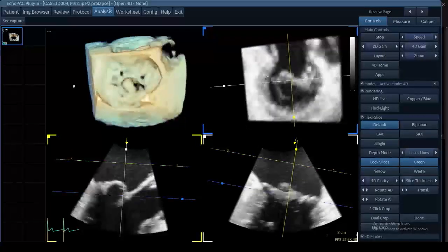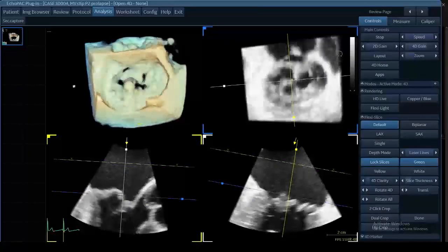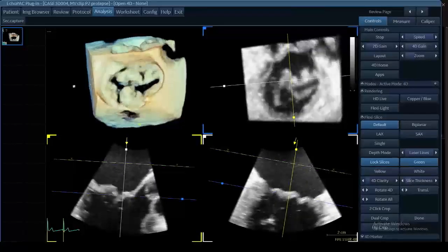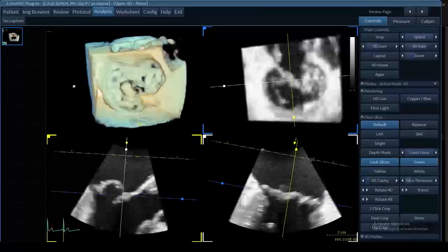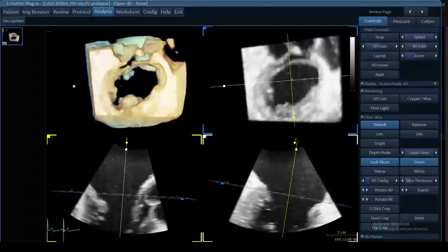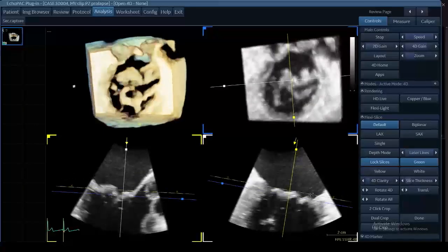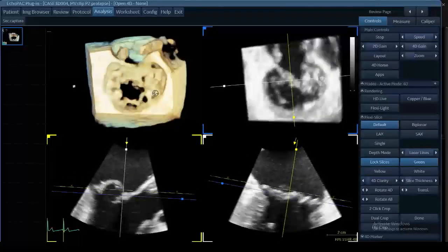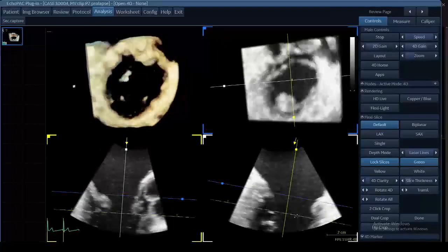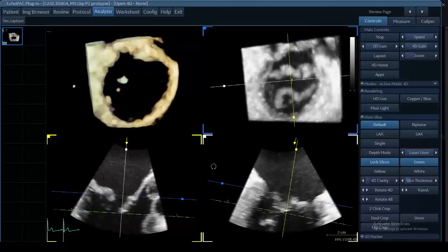So now, again, we have the blue plane along the valve level. So that's why I see my blue plane, the short axis. I've decided to mirror the blue plane. And then this is the crop adjust, or the plane adjust. You can increase where you're looking from, or you can decrease. And you can see, as I'm going down, I see less leaflet detail. If I crop, now I'm no longer seeing the prolapse because the prolapse is getting above the crop adjust. If you go into the ventricle, then you're looking towards more ventricle. So that's why you can't see the mitral valve anymore.